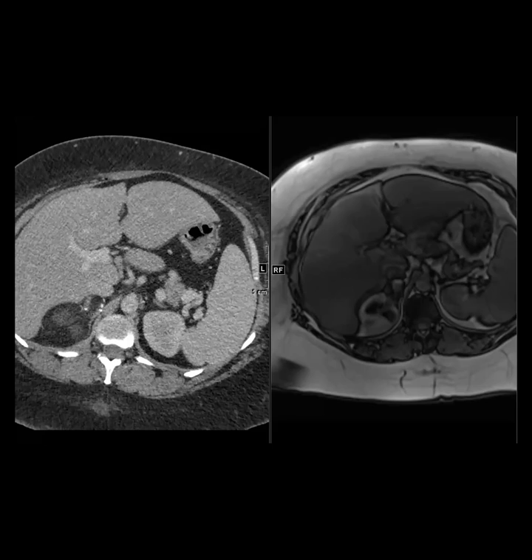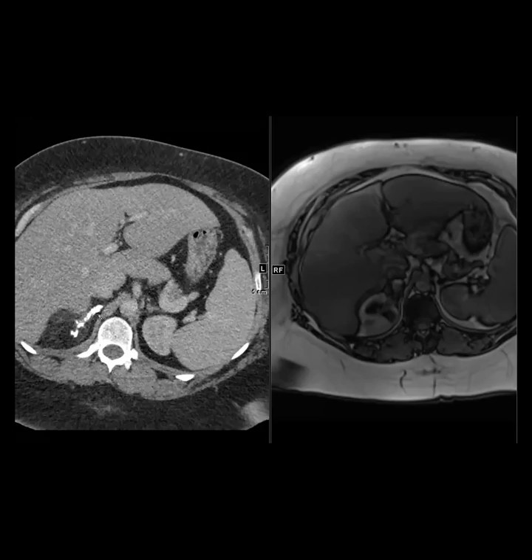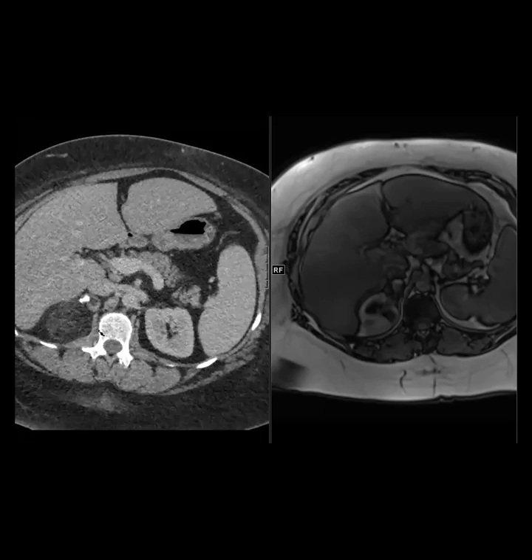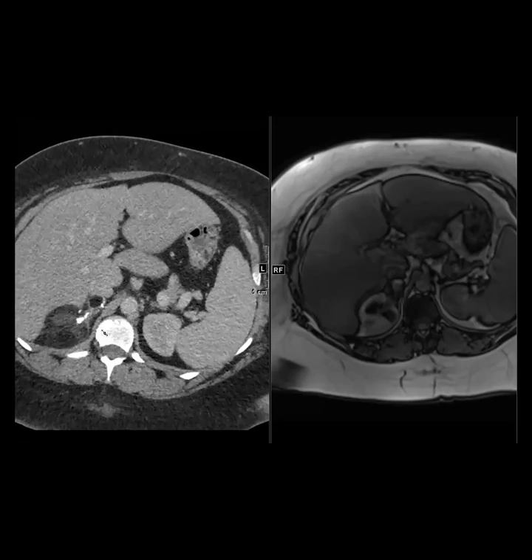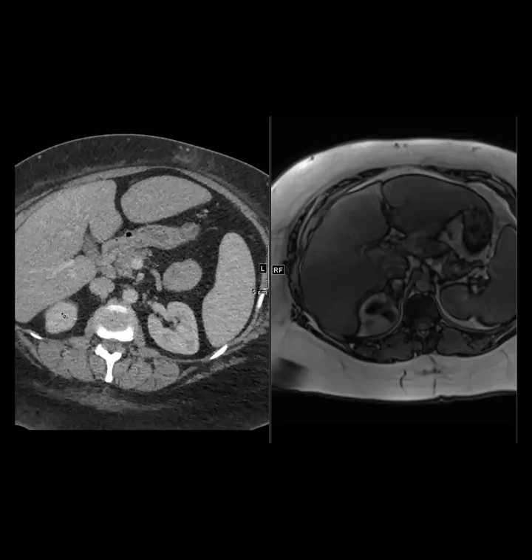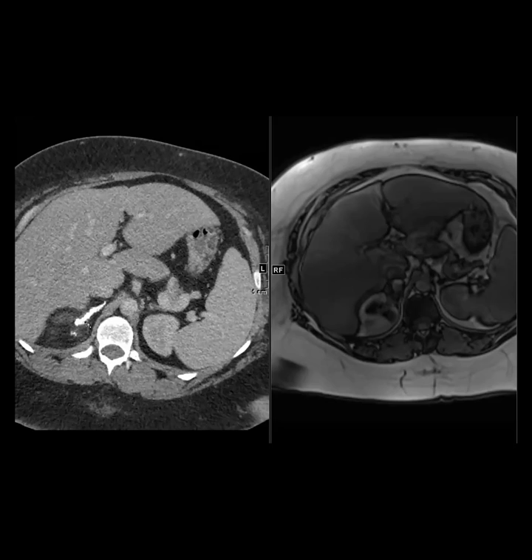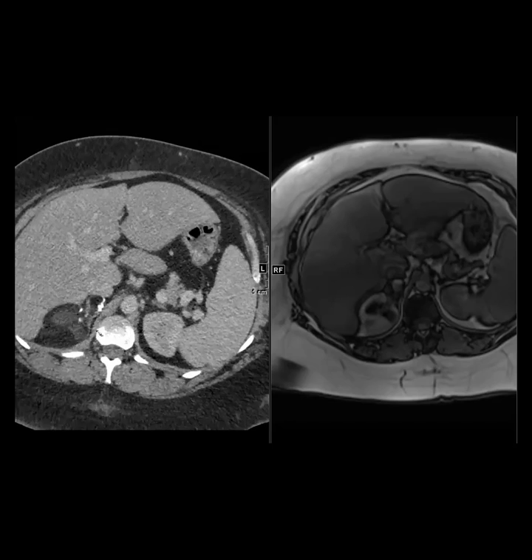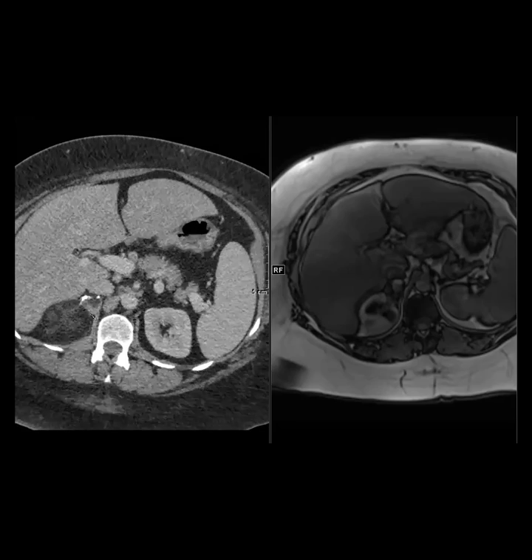A quick question. That calcification, can we have that? Initially, I thought maybe this is one of those big exophytic RCCs with gross fat. Can we have that much calcification with a benign myelolipoma? I think so, you can definitely have calcification with myelolipoma. And this one is not coming from the kidney. The other thing you think about with calcification in the adrenal is that adrenal cortical carcinomas can have calcs, and that makes me more alarmed when I'm debating between a pheo and an adrenal cortical. But those tend to have central necrosis and then calcification in the central area, so this really didn't look like an ACC to me.